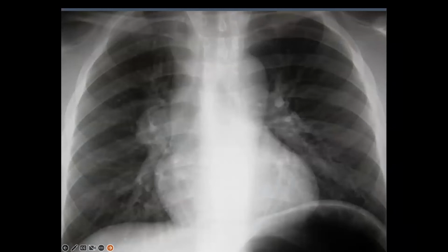This patient is a little bit easier because there isn't a lot of parahilar opacity here. You've mostly got your vessels, and then you have this convexity in the region of the right hilum. And that's very different than the left hilum, where you have the normal concave appearance to the vasculature. So this is what you expect to see if you have hilar lymphadenopathy. You expect to see a rounded contour that pokes out from the hilum in this way.